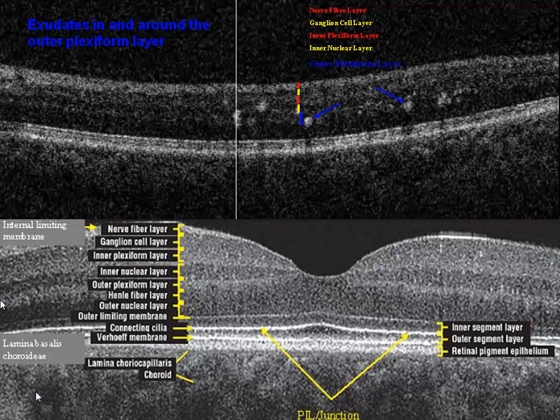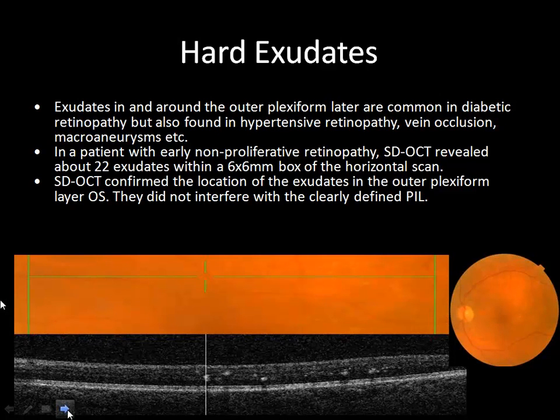Those are exudates. And exudates you can get in a lot of different conditions. Certainly diabetics have lots of exudates, and hypertensive patients. So these are hard exudates, but they're in the middle of the retina. Turns out that many of them are invisible to ophthalmoscopy. So for example, here's an OCT horizontal slice. You probably don't see any exudates here. And right over here in the bullseye, crosshairs if you will, there is an exudate, which is below the resolution of fundus photography and of direct ophthalmoscopy.